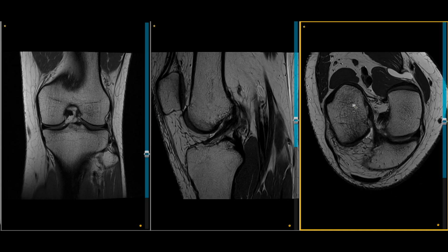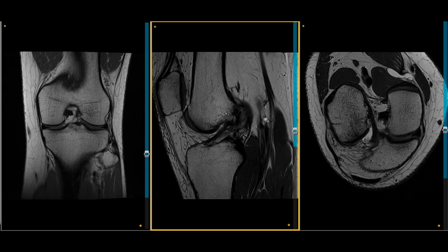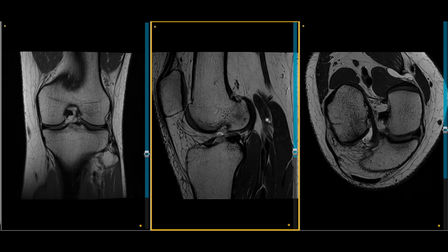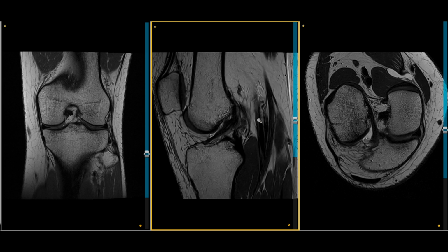So the fork tongue outcomes are typically associated with ACL injuries that have a greater degree of tissue displacement outside of the notch at the initial start point, or larger gap distances between the two ends of the ACL.